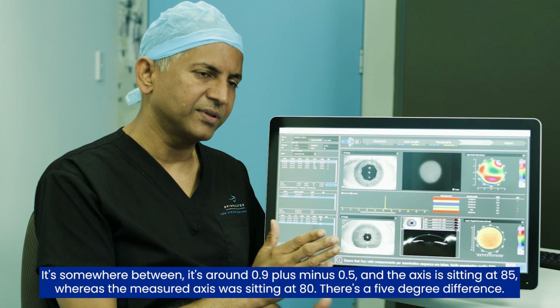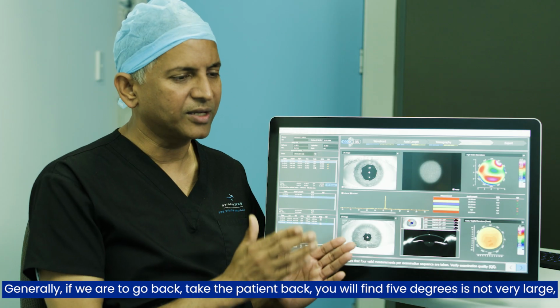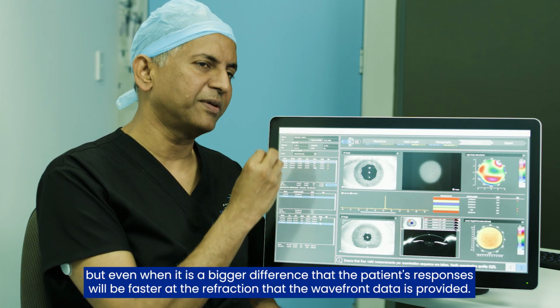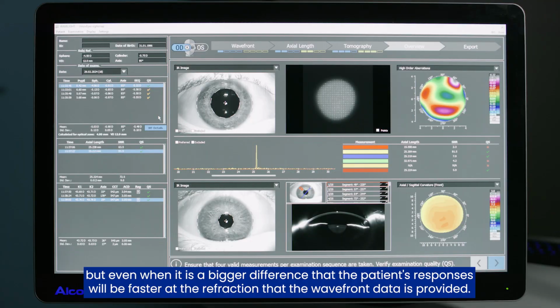There's a 5-degree difference. Generally, if we are to take the patient back, you will find 5 degrees is not very large, but even when it is a bigger difference, the patient's responses will be faster at the refraction that the wavefront data is providing.